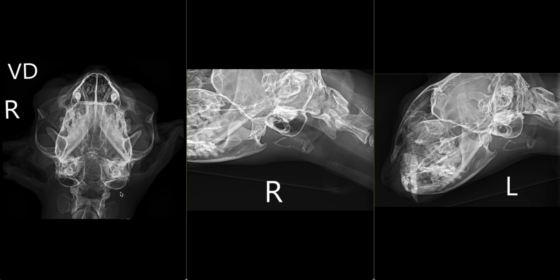Further evaluation can be made with computed tomography, which would allow for characterization of the material within the bulla. Given the relatively non-aggressive appearance of this, as well as the absence of neurologic changes, it would be unlikely to see changes extend into the calvarium. However, this could be observed with computed tomography when using contrast or with magnetic resonance imaging.